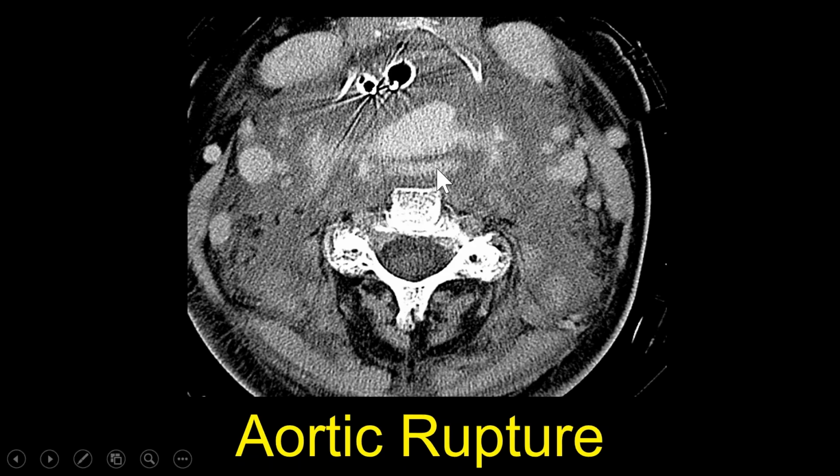This was a very rare case of somebody who was in a bad car accident, and I went to check the CT scanner, and I saw all this contrast at this area, and they rushed in to check the patient, and he had actually had an aortic rupture that extended up superiorly, dissecting along these spaces. So this is actually the prevertebral space, and this is the retropharyngeal space with this fascial layer in between them, with all this contrast in front of the vertebral bodies. A very rare CT of an active aortic rupture ascending. And this high density we see is actually contrast from his aorta that was dissecting up in his neck on that study.